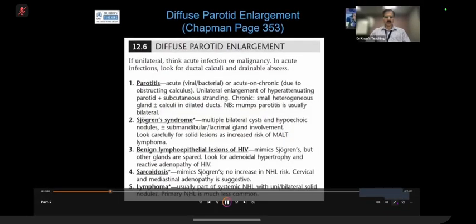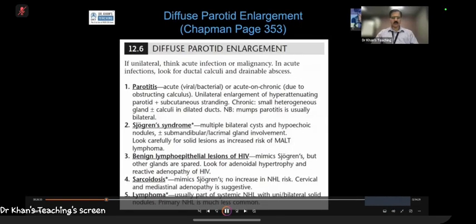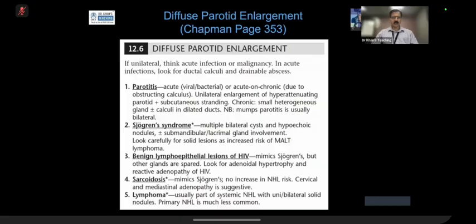Basically, pathologically speaking, what happens is that there is destruction of the parenchyma, and there is dilatation of the intraparotid ducts. And this presents as these punctate, small cavities, and there are various grades which I am going to show you. Please also remember that there can be also deposition of lymphoid aggregates, and you have to rule that out because that will be what we call soft tissue nodules.